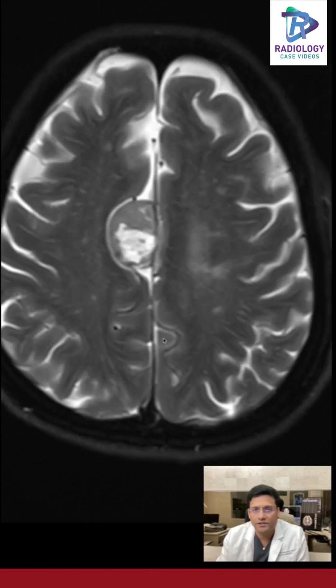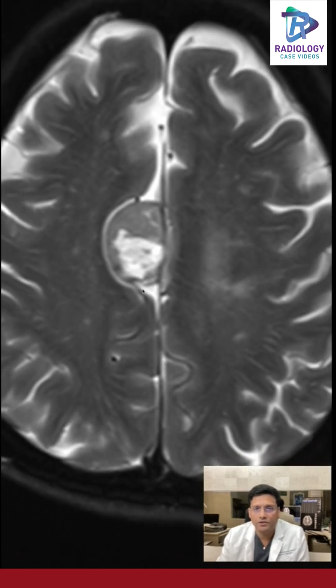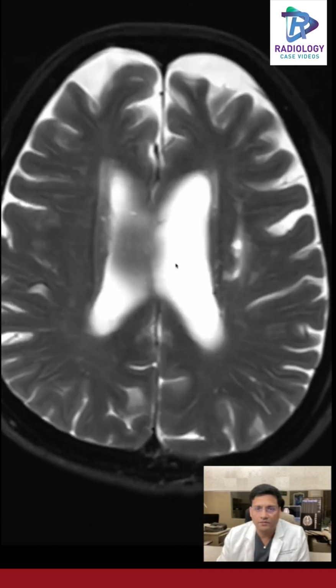Let me discuss an interesting case which I encountered yesterday. The patient presented with seizures, and we performed an MRI brain. This is an axial T2 weighted image. You are seeing a broad-based or dural-based lesion which has a broad base towards the falx, and the lesion is causing gray matter buckling, and you are able to see this clear CSF cleft between the lesion and the brain parenchyma. These are all hallmark features of a meningioma, which you should be aware of. The lesion was also indenting on the corpus callosum and cingulate gyrus. So this is a classical case of meningioma.